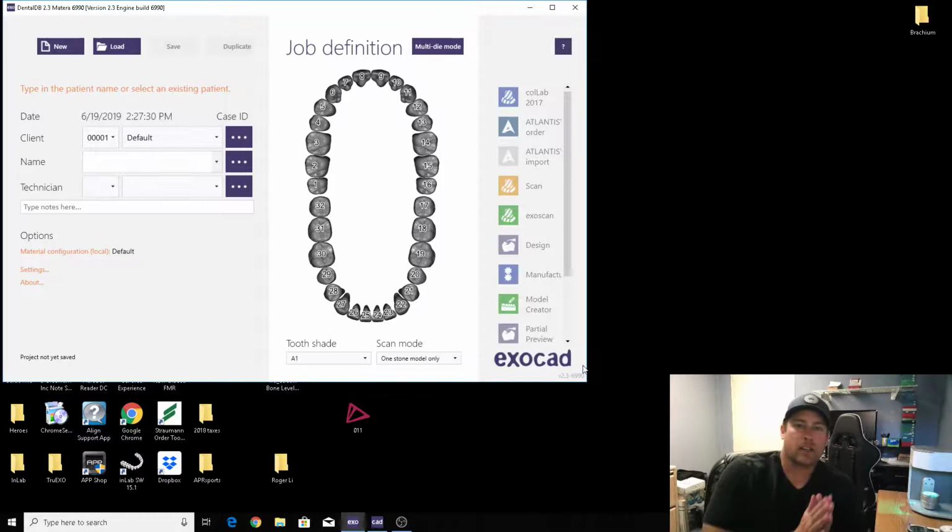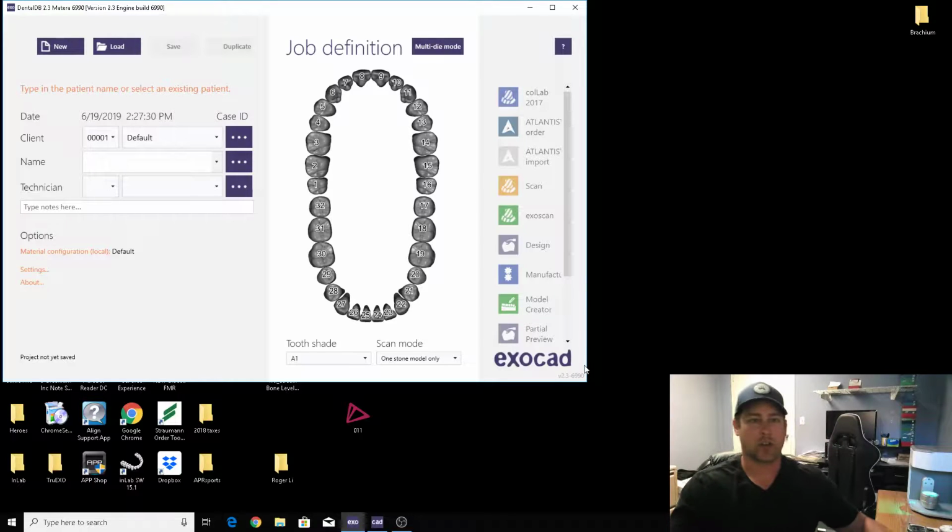What's up, everybody? In today's video we are going to be discussing simple scan techniques using the method scanner over here. You can use these techniques for pretty much any scanner, so follow along and hopefully you can learn something that you haven't before. I'll also be showing simple CAD designs too, just using basic hotkeys and whatnot. So go ahead and get started here.